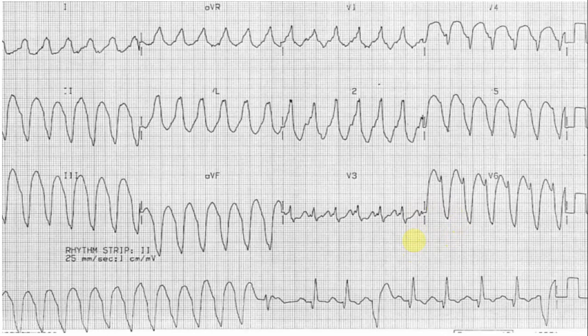Now, to compile all this information together, I am of the impression that the patient has monomorphic VT. I am very concerned about this patient. My immediate action would be to assess the hemodynamic stability of the patient. Then, I'll give appropriate treatment such as DC cardioversion under some procedural sedation. This is another bread and butter ECG for any emergency medicine doctor. I found Brugada criteria very useful in interpreting such an ECG.